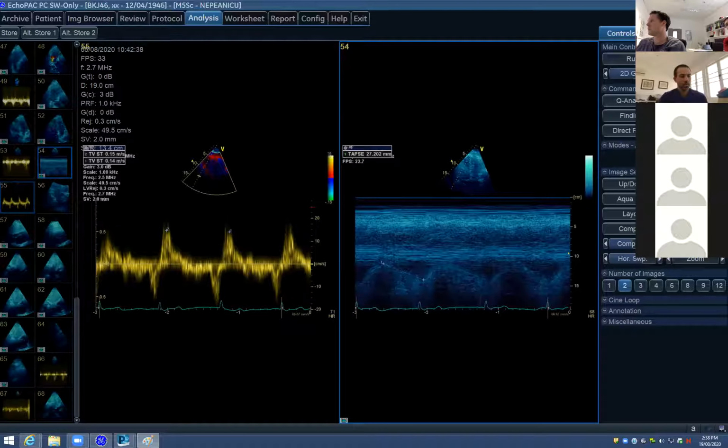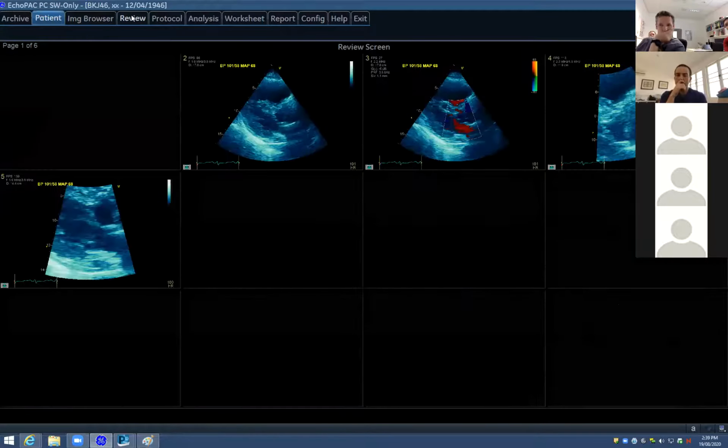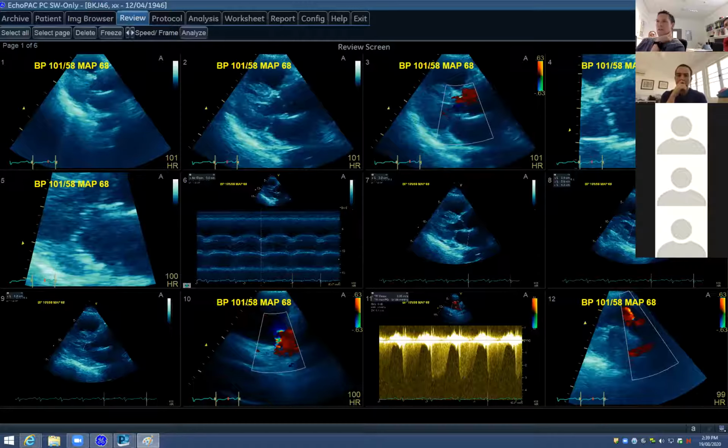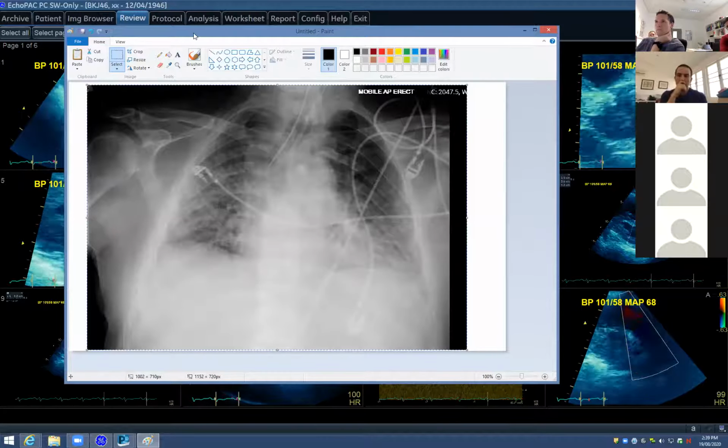Well, my overall conclusion would be it's a chap with undifferentiated interstitial lung disease of some form, with probably at least moderate pulmonary hypertension, probably moderate TR, and I would say that he's got right ventricular hypertrophy and right ventricular enlargement, but preserved systolic function, which suggests that he's got compensation and probably preserved RV-PA coupling.